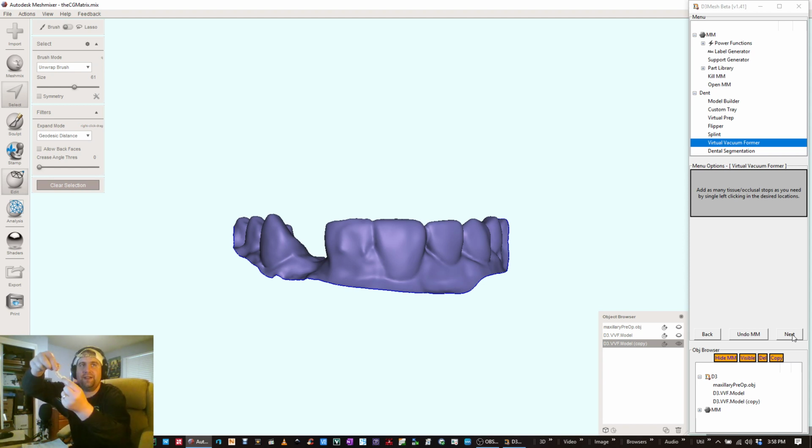And again, let's see if I can... Oh yeah, you can kind of see that. I'm twisting this guy pretty good, and it's maintaining its shape, its form. So, cool. That's what that looks like. That's what that feels like once it is printed out.